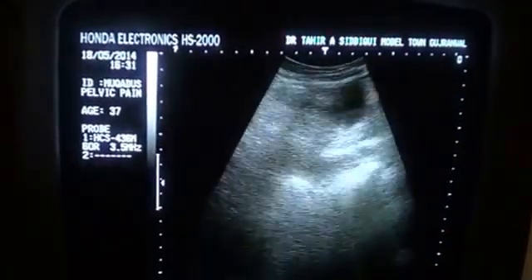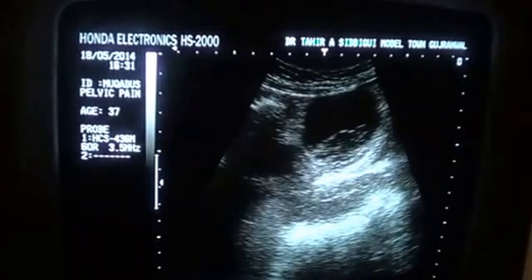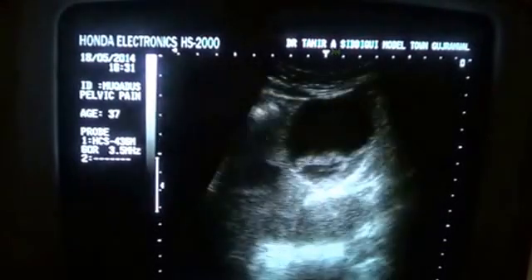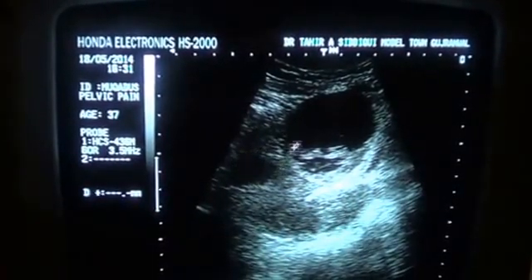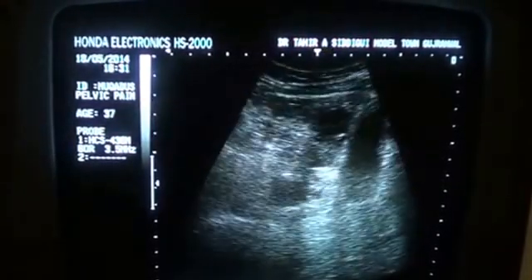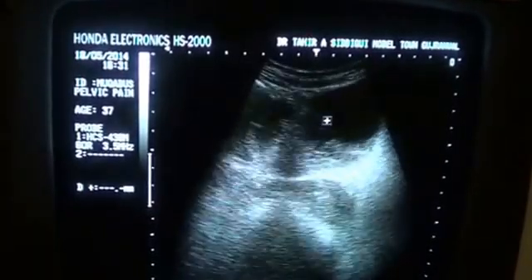And the only findings are that I have narrated to you repeatedly now, that there is a cystic area with a breach communicating with the larger cyst anterior to the uterus. There we are. This is the fundal region cyst, this is the breach, this is the larger cyst anterior to the uterus, and there is a small amount of fluid in the dependent region of the peritoneal cavity. This is the fluid. So this is our case of the day.